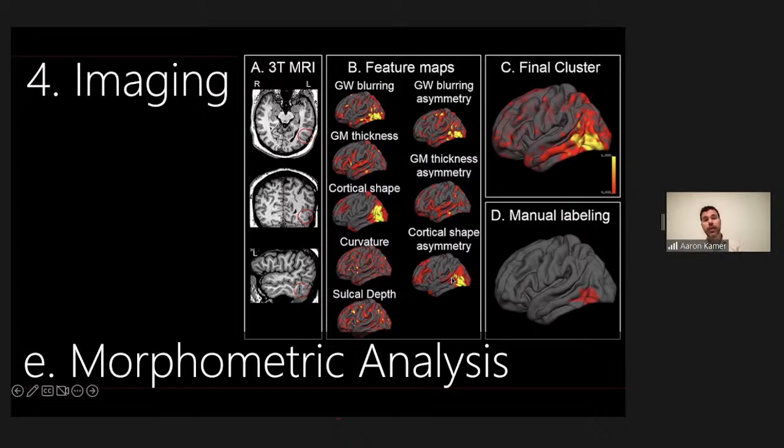And then going back and looking at the anatomic MRI images, it's a little bit easier to see the abnormality that's down here in the left temporal lobe posteriorly. So we can see that cortical thickening. We can see the blurring of the gray-white in that region of cortical dysplasia.